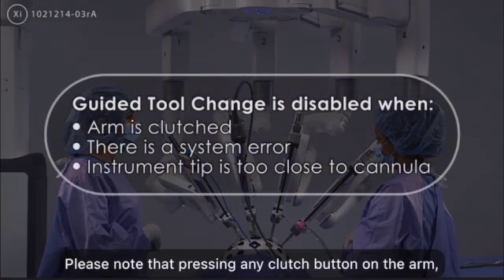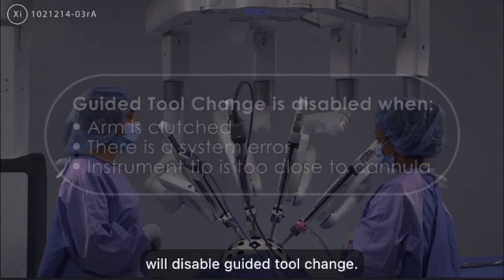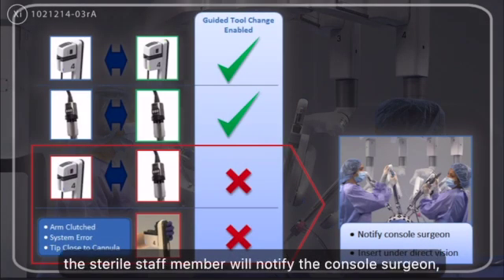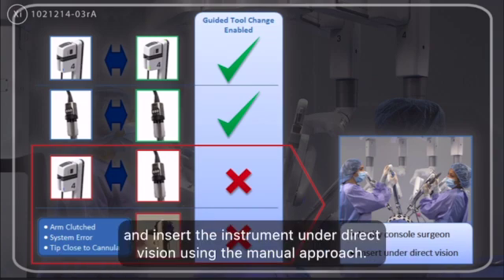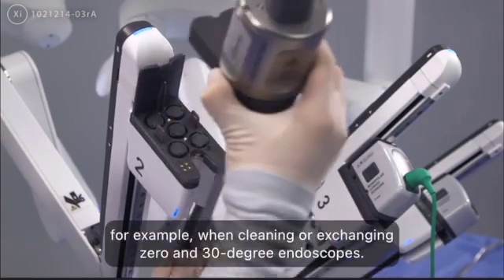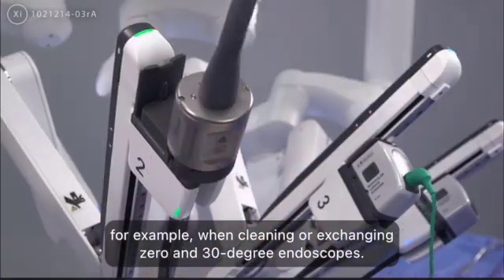Please note that pressing any clutch button on the arm, as well as a few other conditions, will disable guided tool change. If the instrument clutch is pressed by mistake, the sterile staff member will notify the console surgeon and insert the instrument under direct vision using the manual approach. Guided tool change also works for the endoscope, for example when cleaning or exchanging 0 and 30-degree endoscopes.